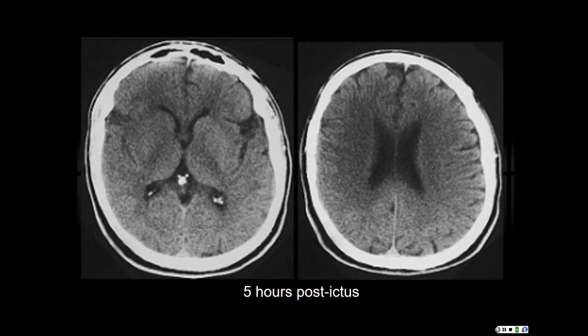Why aren't the thalami affected? Why isn't that right thalamus affected? It's supplied by something else. What's it supplied by? The posterior cerebral artery. Board's question. The thalami are posteriorly supplied.